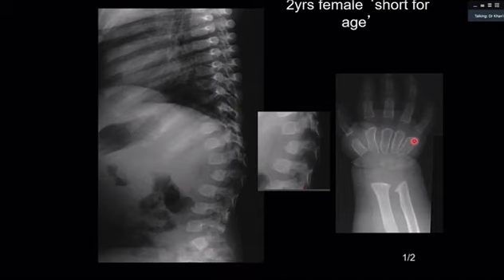Right. Now, if you look here, this gives you a proximally tapered appearance. If you see these metacarpals, you will appreciate that they are slightly thicker here, and proximally they are tapered, right? This is a congenital abnormality, which is again an exam abnormality, but this thing is the key which you have to pick up.